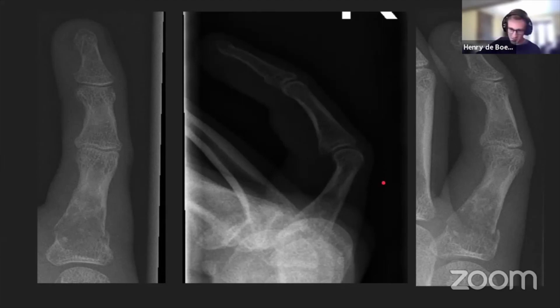Yeah, so you're all spotting the fracture, quite an obvious fracture, a transverse fracture through the proximal shaft or the base of what I think is the little finger proximal phalanx. But yeah, as someone spotted, there is a bone lesion here. So this is normal bony architecture, trabecular pattern. And here there's disruption, there's lucency, probably some slight expansion, a tiny degree of expansion. So the bony margins have widened and the cortex is thinned from the inside.